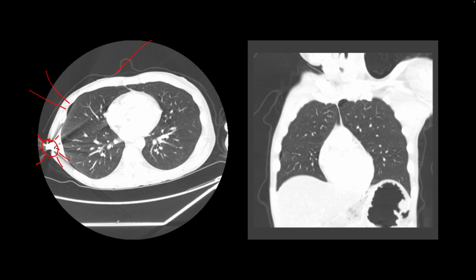So is it pneumothorax or is it an artifact? Look at it in the coronal projection. It looks like a focus of air, but it's not. It's an artifact because of this metallic bullet fragment that is lodged in their chest wall. So be aware of this artifact.